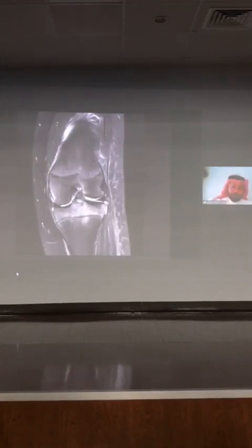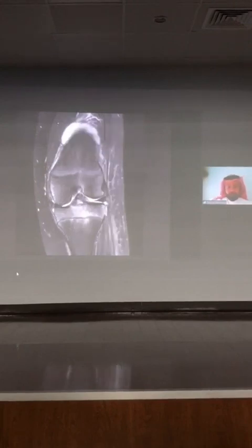For the Segond fracture, there have been multiple hypotheses. I have published with the orthopedic team at King Abdulaziz University on that issue. Initially, it was thought that the Segond fracture was due to capsular avulsion that leads to this. Now there are talks about a new ligament that they are trying to coin, the anterolateral ligament. It is actually thickening of the capsule. They are just trying to call it a ligament, and avulsion of the anterolateral ligament, or the ALL, is what contributes to this Segond fracture.